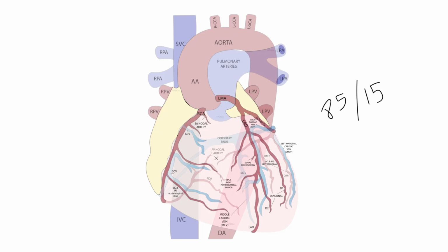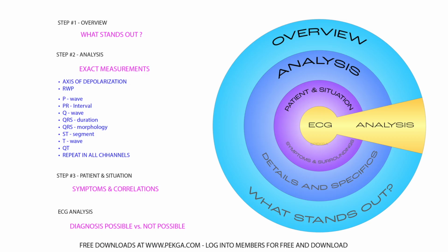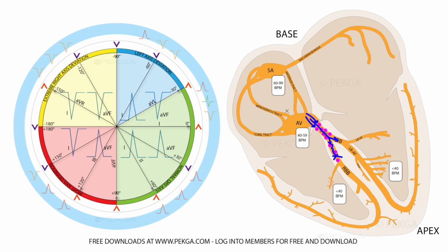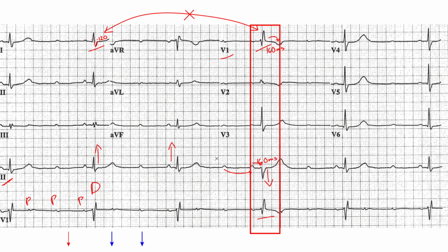However, you should be thinking about blood supply to the AV node. Excuse me, here I'm talking about the AV node, but really I should be talking about the bundle of His. You've got to be thinking about what supplies that region. And anytime I get blocks, I'm always concerned about ST elevation and other things that might show up with a lack of perfusion to the heart.